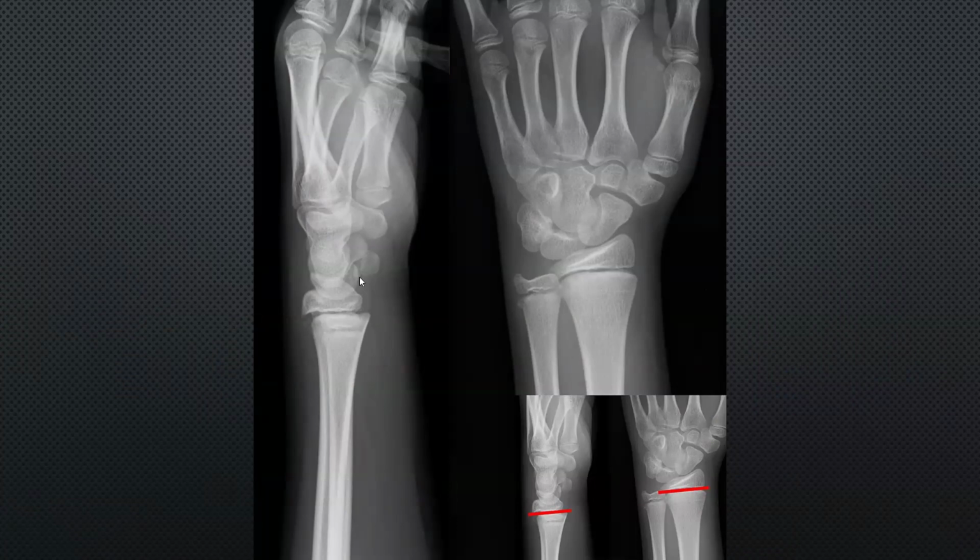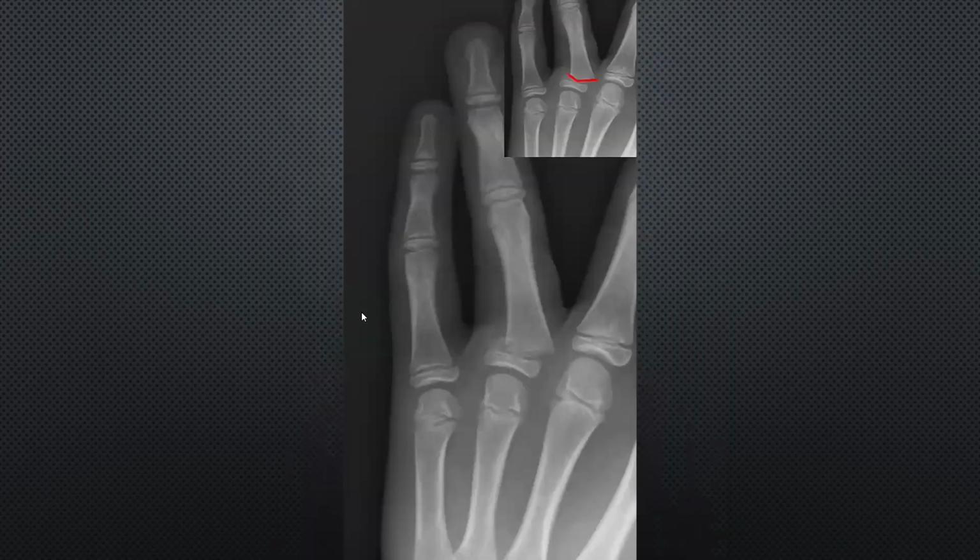So what is the classification of the fracture? This is a type 1, slip, a good prognosis. This is type 1, straight across the physis. Okay. And this one is above the physis, so it's type 2. So what is this X-ray?